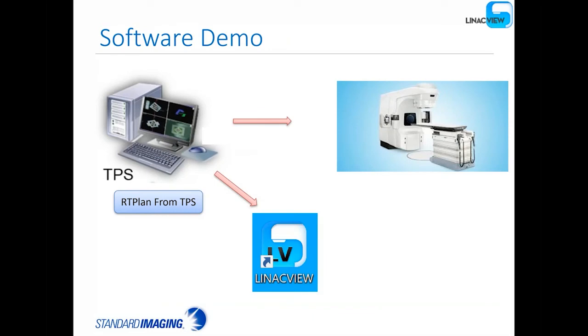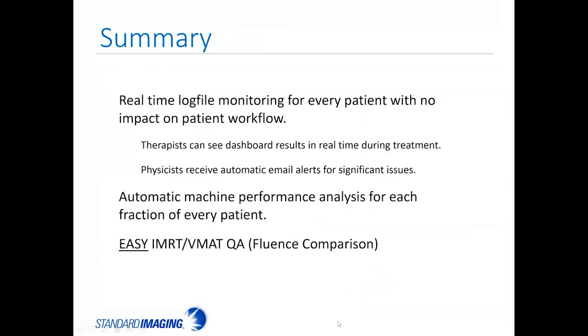Now I'll provide a brief software demo, but I wanted to give you some background about where we're starting with the demo. At the time when the demo starts, I will have exported, pretending to have exported, an RT plan from the treatment planning system, and also exported to the Linac. I will start the demo by pretending like the Linac log files are coming into LinacView. Okay? Let me bring that up now.